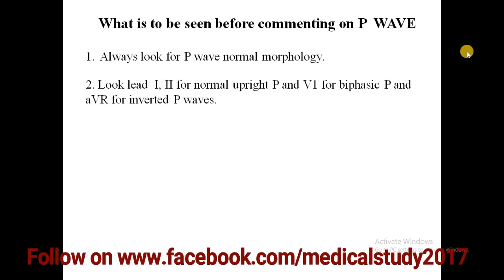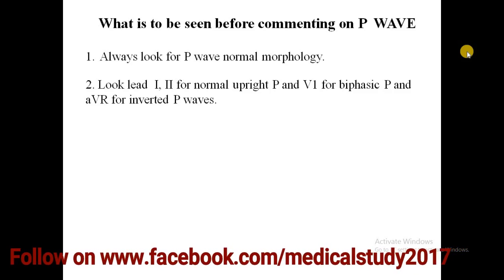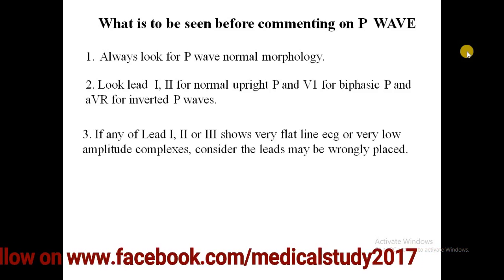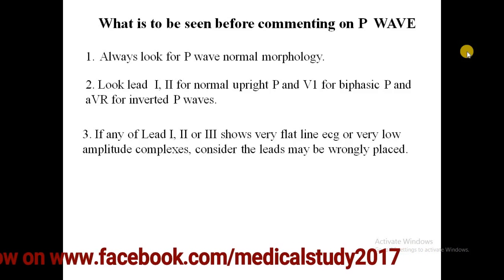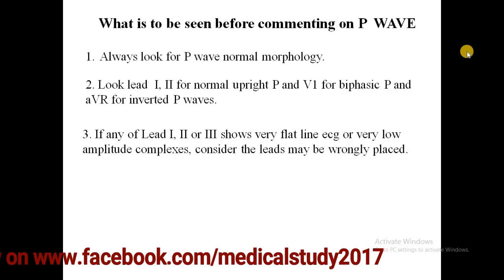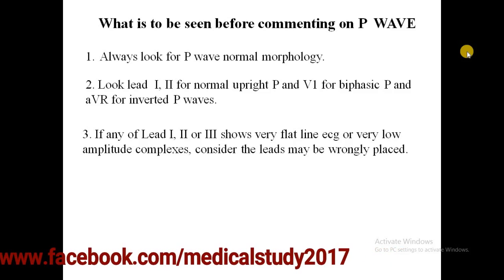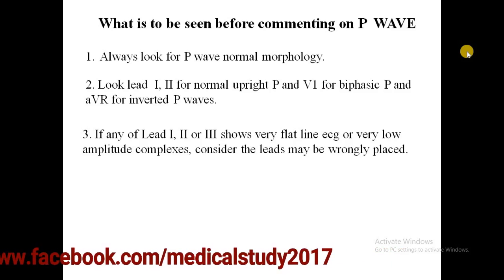So for that there are 1 or 2 tips I am telling you. One is, if in any of the leads 1, 2 or 3 you see a very flat line ECG or very low amplitude complexes as compared to other leads, consider the leads are wrongly placed.